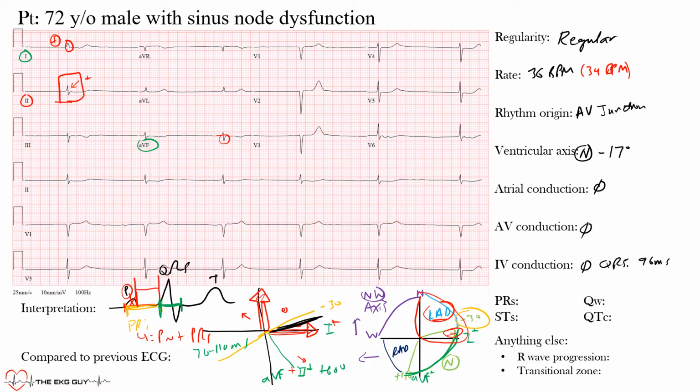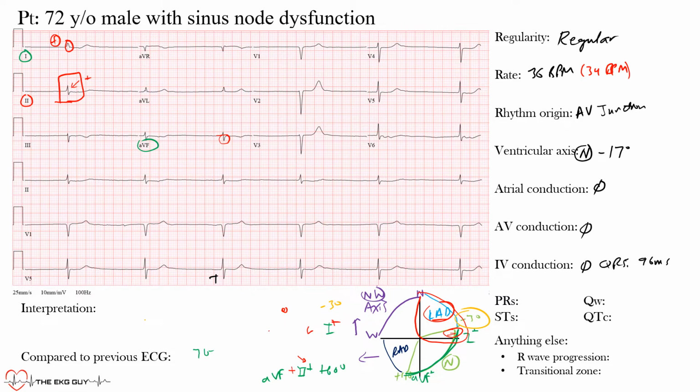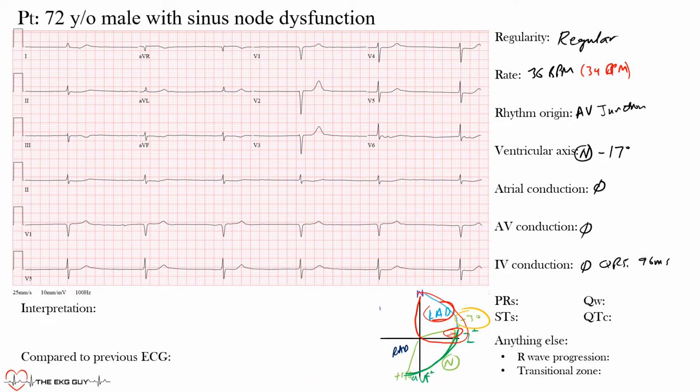Next we want to look at the waveforms, and that's the next portion there. So let's start looking at that. We'll just erase some of this here, and then we'll move on to that. Hopefully this is making sense. Again, we're finding a lot of different things, and as you can see, going through an EKG, you have to have some sort of systematic approach, or more often than not you'll miss something. We don't want to miss anything that's crucial, especially when it affects patient care. And that's why we always do this systematic approach as we move through the EKG.